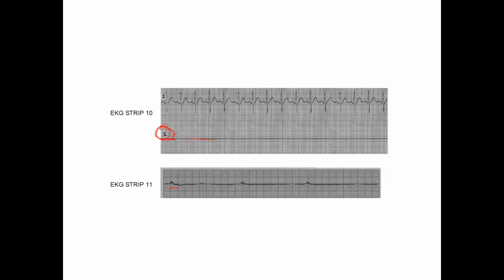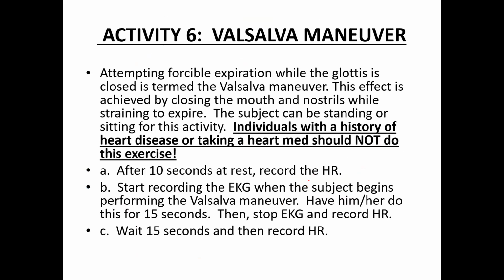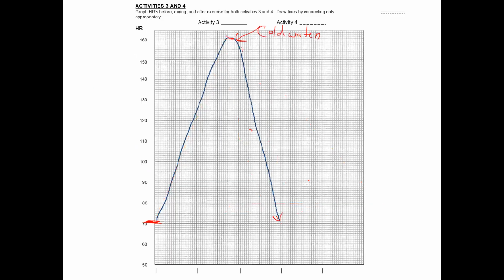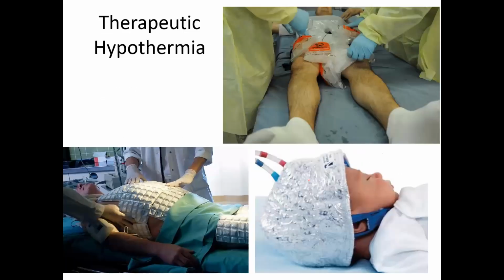And this thing, either there's a big problem with this person, they have no cardiac output, just a little QRS there, or whatever that is, or you did something wrong with setting the frequency of the machine, or the leads aren't put on correctly. But the most common that we'll ask is going to be skeletal muscle artifact, like the picture we saw before. Let's see if we can find that one again. It's kind of common. Went the wrong way here. The skeletal muscle, you saw it before. Anyway, let me go to the next thing I forgot to talk about.